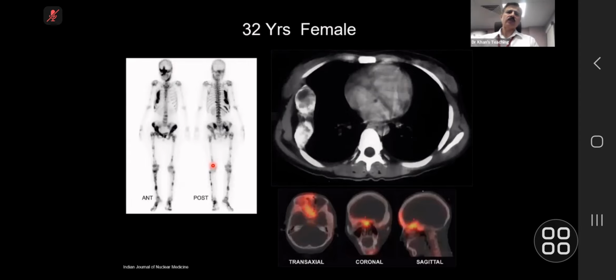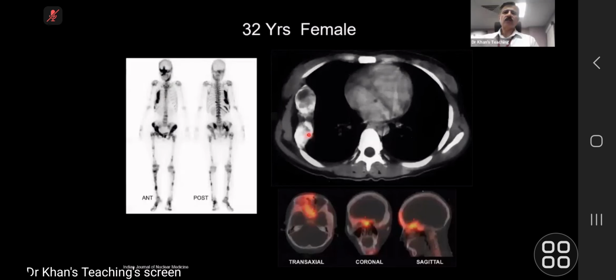Multiple lesions, and look at this lesion here, and look at this one. And this is the rib, which is fibrous dysplasia at the base of the skull. Again, this is a SPECT nuclear scan, which has got uptake there. This sign in literature is known as the pirate sign. You can make out a pirate, you see this. So, pirate sign. So this is the sphenoid wing.